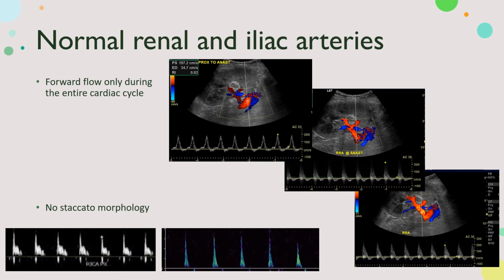Now, you have to be careful because if the sonographer is Dopplering what they're calling the anastomosis, you have to look at the color image to see, is that exactly the right location? If they're a little too far into the iliac artery, you're going to see the same waveform. So, for example, the second image is labeled as anastomosis. Is it that she's getting too much of the iliac signal in there, or is it really pathologic?